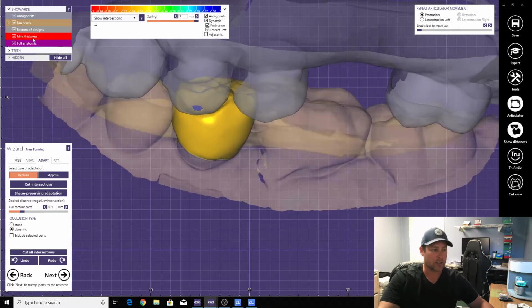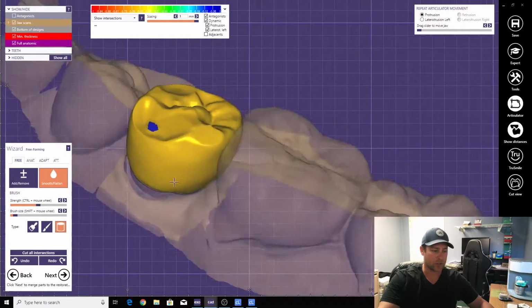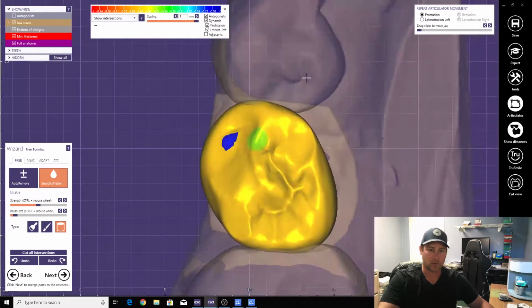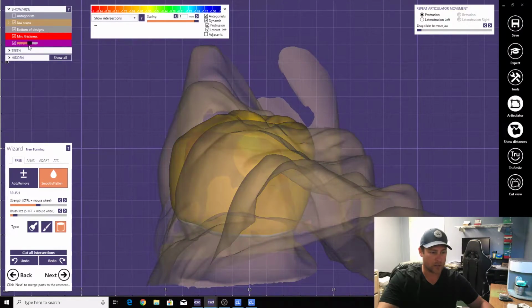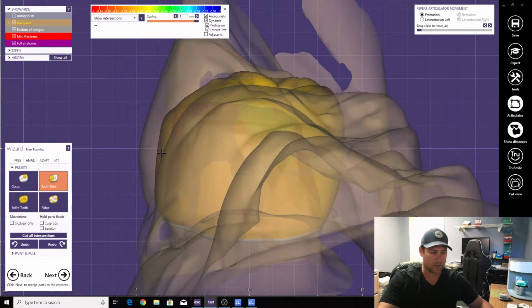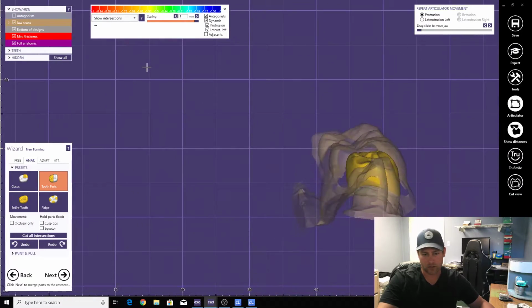Okay, let's go ahead and cut that. And before I go ahead and do anything else, I'll smooth out all these sharp edges. We don't want those. Okay. Let's also check thickness. Pretty thick here, so let's bring this down in. There we go. Down the corridor.